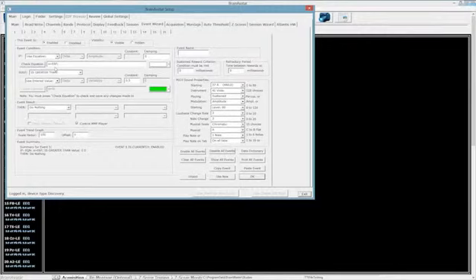Now, a Boolean controller, for those of you who don't know what that means, is basically a true-false statement. So if the event condition for event 6 is true, then what I'm getting returned here is a 1. If it is false, I'm going to get a 0.